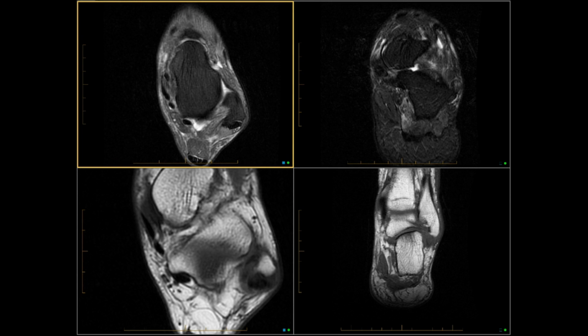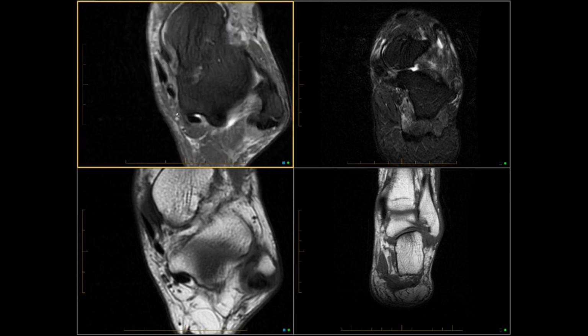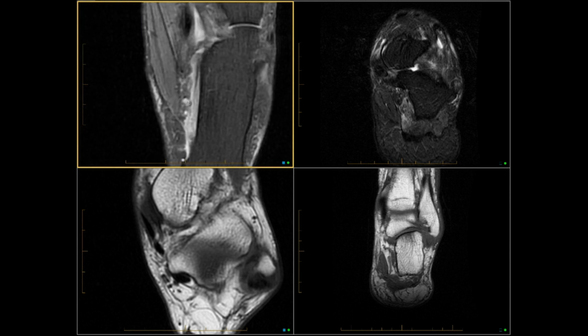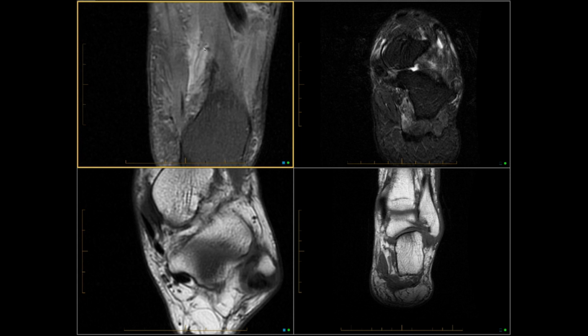So I begin to see these structures here. Some of them will be vessels, some of them will be nerves, and we're going to follow them down. And we get to this region where there seems to be some hyperintense signal change and some enlargement, and even more bulbous changes in this region along something that looks kind of tubular. We can take a look now in cross section. So let's take a look at that coronally.